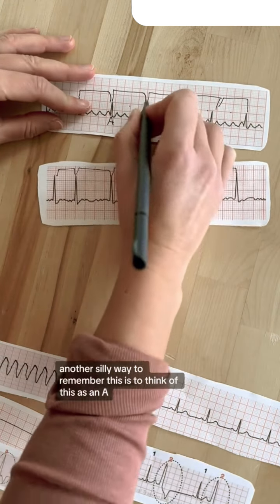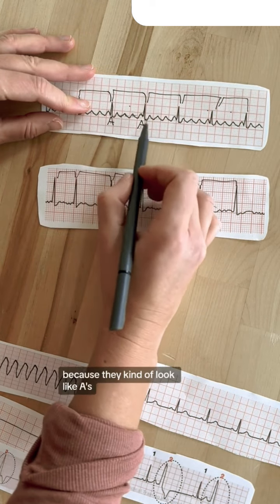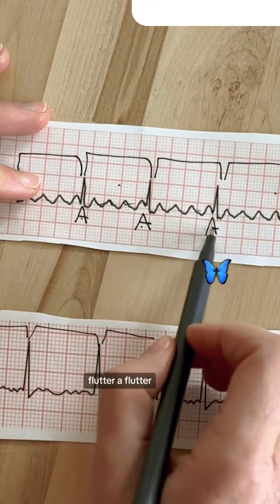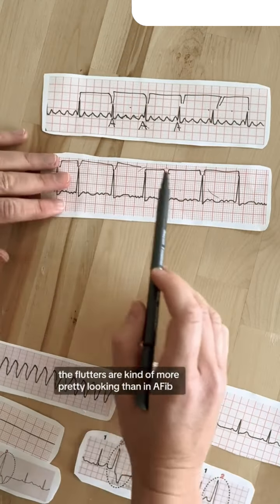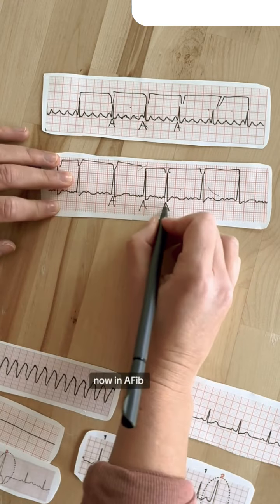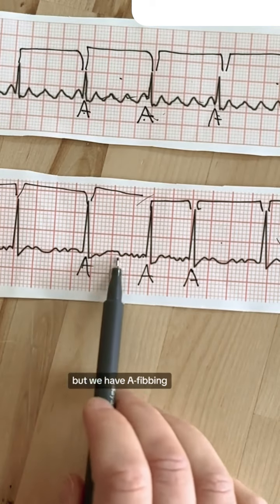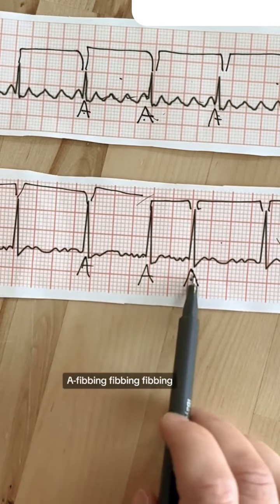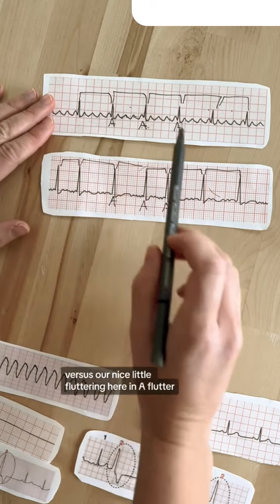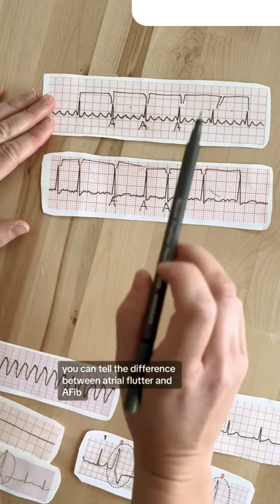Another silly way to remember this is to think of this as an A and this as an A because they kind of look like A's. And you can think A, flutter, flutter, flutter, A, flutter, flutter, flutter. The flutters are kind of more pretty looking than in AFib. Now, in AFib, these do look like A's as well, but we have A, fibbing, fibbing, fibbing, A, fibbing, fibbing, fibbing. They kind of look more irregular versus our nice little fluttering here in atrial flutter. So now hopefully you can tell the difference between atrial flutter and AFib.